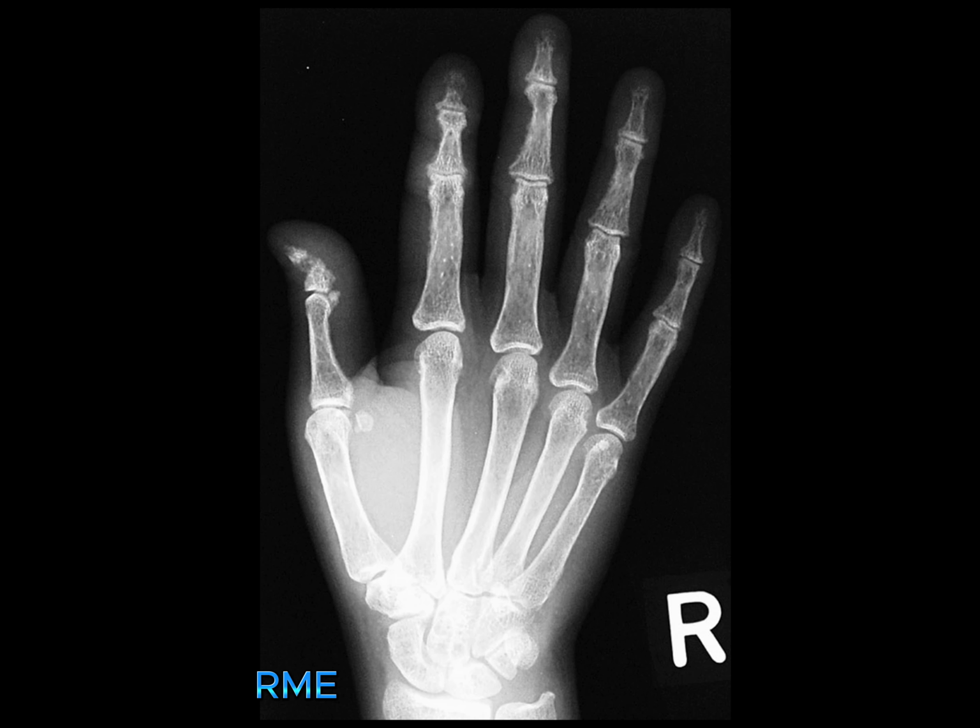This image shows erosion and resorption of digital tufts, osteopenia with coarse trabecula, and subperiosteal bone resorption along the radial side. These findings are indicative of hyperparathyroidism with acroosteolysis. Differential diagnoses for acroosteolysis include frostbite, electrical burn, polyvinyl chloride exposure, pycnodysostosis, neuropathy, psoriatic arthritis, and Hajdu-Cheney syndrome.